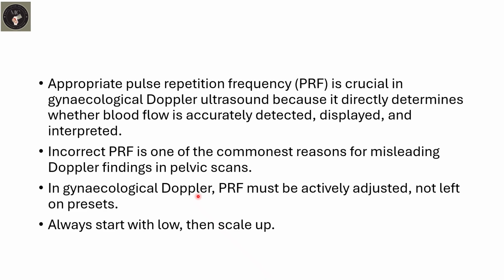The machine I use has a preset of 1.3, and a preset of 1.3 is high for a good number of gynecological pathologies like ovarian, endometrial. Unfortunately, at times, it's after the scan, when I'm transferring the images to my flash, that I realize that I didn't change the preset. So it's absolutely important not to depend solely on the presets of the machine, but rather to adjust the preset depending on the structure one is interrogating.